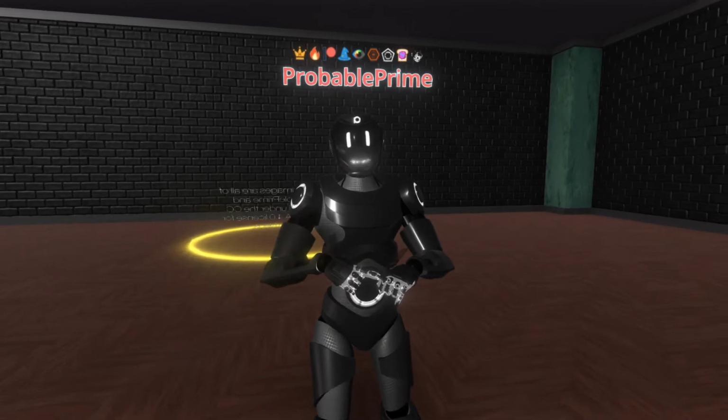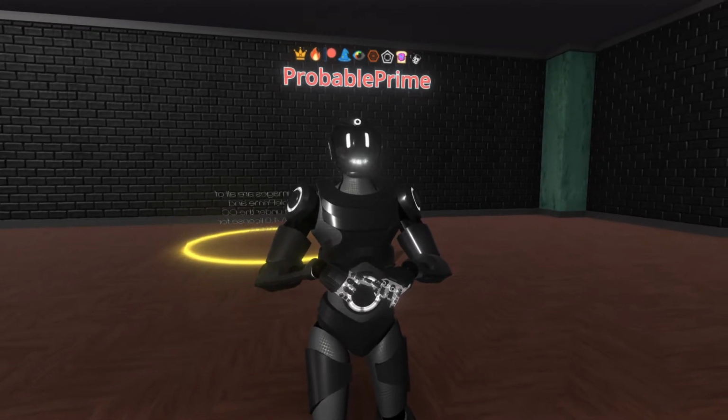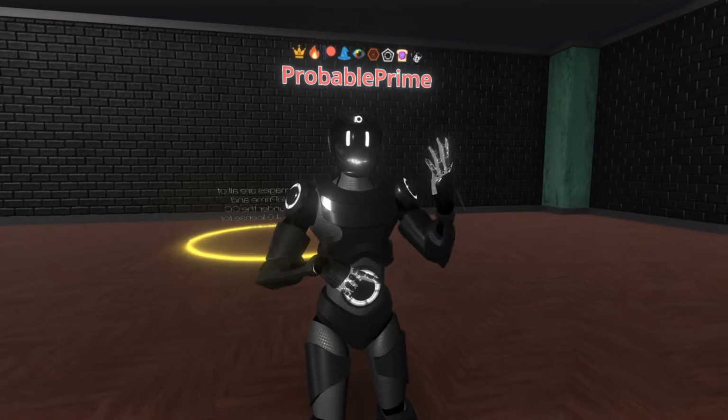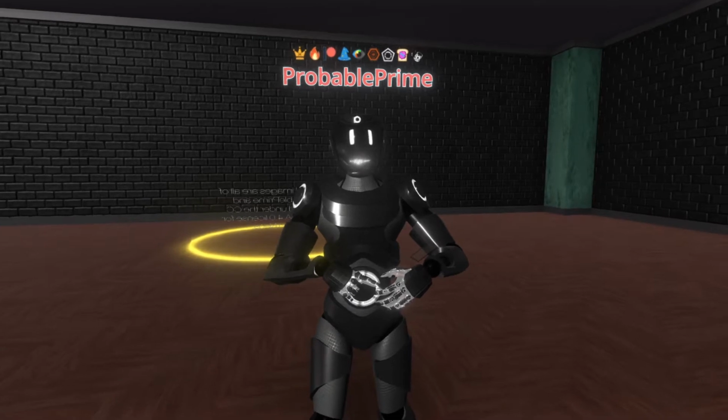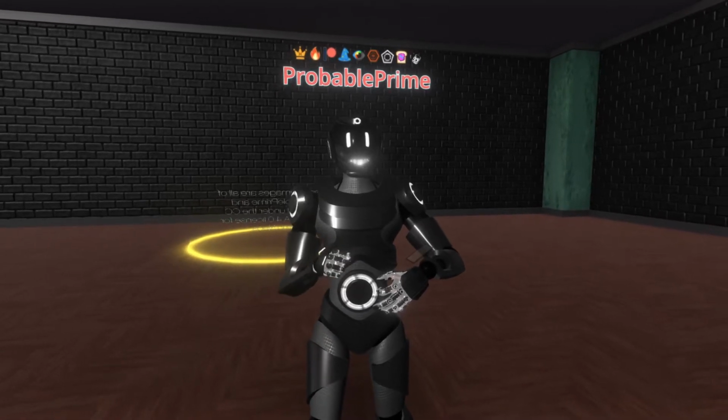Welcome, my name is Probable Prime, and I'm here to show you some medical imaging which has been imported into virtual reality for reviewing, visualization, and discussion. These images are all of me, and so therefore I own them, so let's take a look at them.